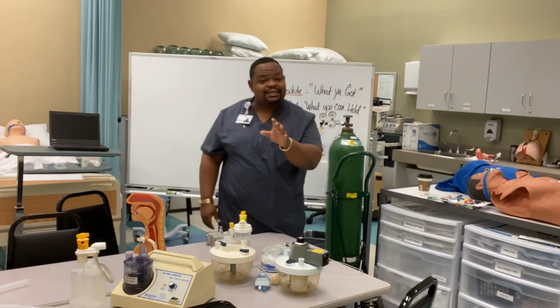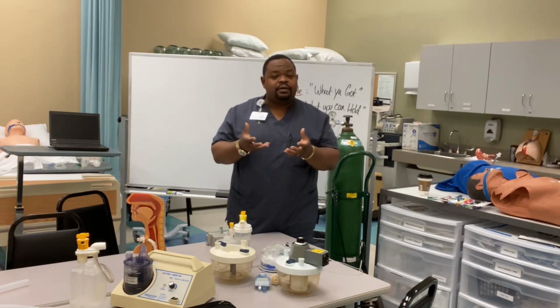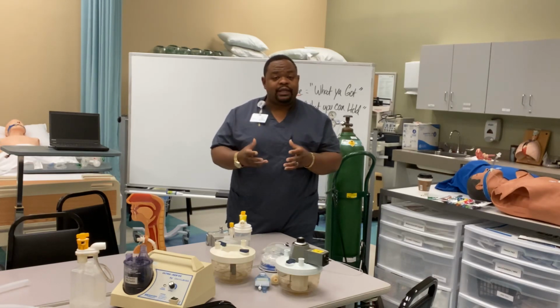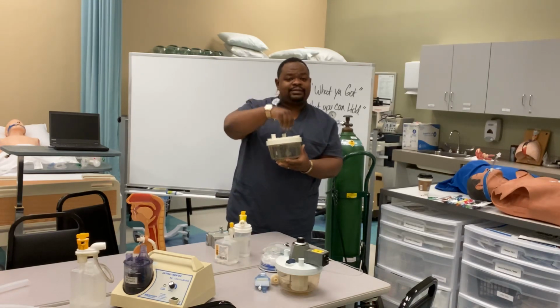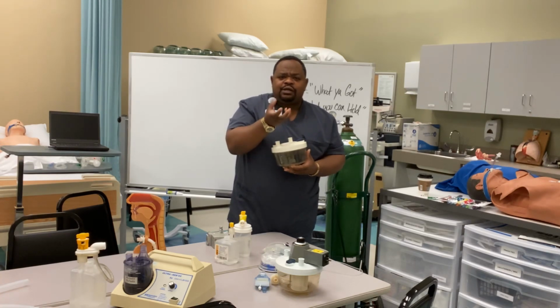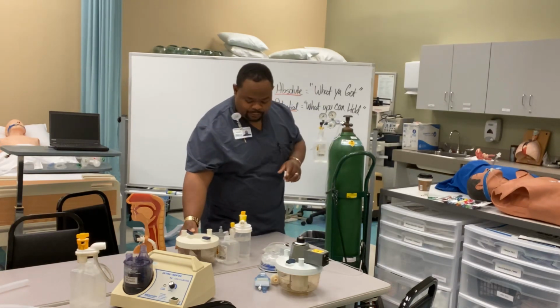So that is the cascade and the Passover, right? You also have the wick type Passover, right? The wick type humidifier, with or without the wick. You're going to learn in your book. You need to look in your book or your lab book about the wick type, right? The wick type is kind of like the Passover, but it has wicks down in it. That's like a material like cloth, right? And it soaks up the water that's in here, and that's how you get your humidity, right? It's called the wick type, all right? So make sure you read up on that one.